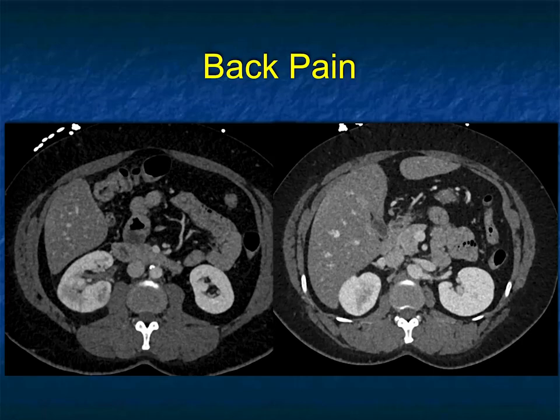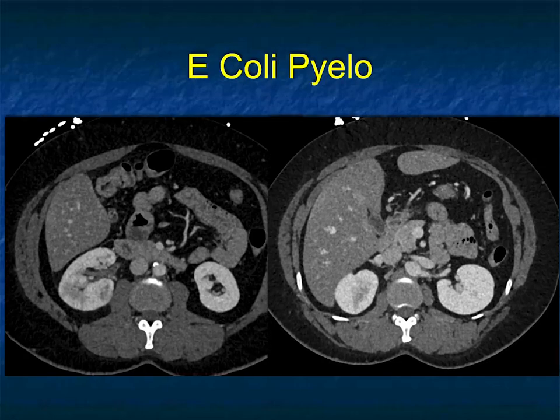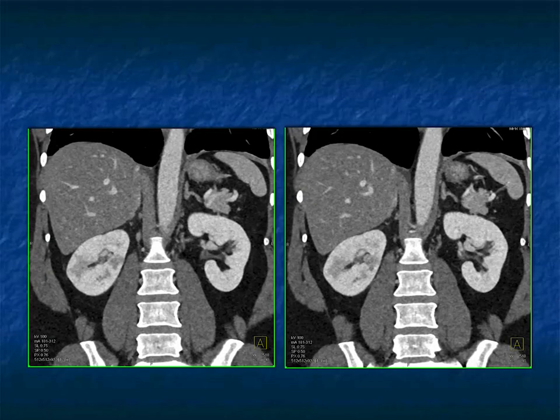You look at the kidneys. The right kidney, the corticomedullary interface is there, and the left kidney is basically gone. As you follow this out, you can say, well, what gives me corticomedullary differentiation persisting? It can be infection, it can be obstruction, often by stone disease.